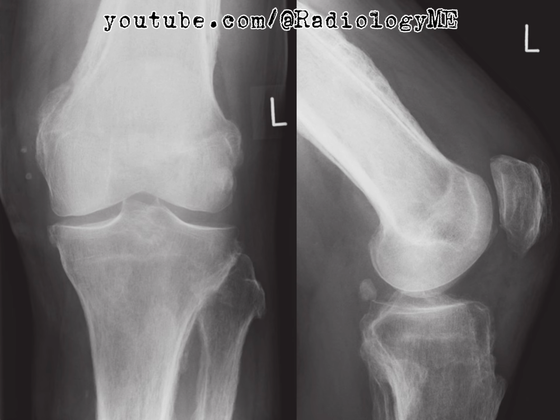Next, the bone scintigraphy adds an additional layer to our analysis. The scan reveals increased tracer uptake along the diametaphyseal cortical margins, especially in the lower limbs. This supports the diagnosis of hypertrophic pulmonary osteoarthropathy, HPOA, given the systemic nature of the uptake, further ruling out more localized causes of periosteal reaction.